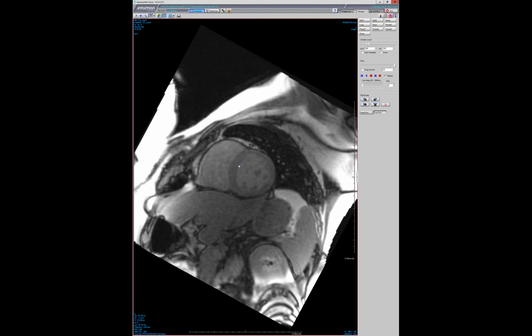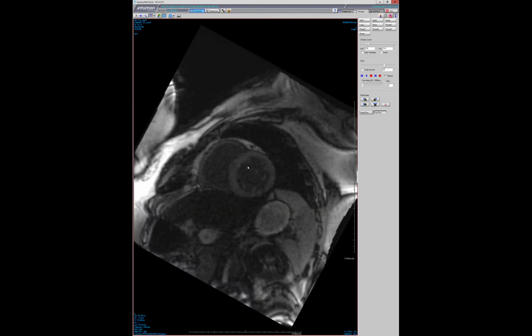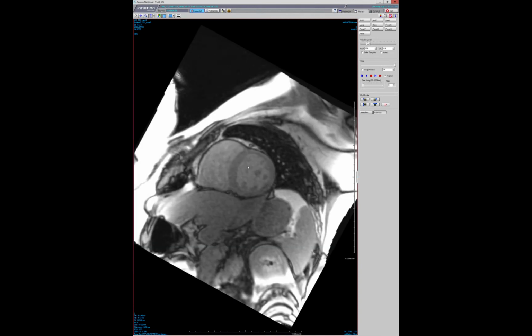So we know that this is a lysosomal storage issue, and they get fatty infiltration in the musculature. Because it deposits, they get the sphingolipids, I think. You guys know better than me, that can deposit. So here, even though the delayed enhancement looks completely normal, the tissue mapping helped suggest that there probably is some mild deposition in the myocardium, although it's not overt, and there's a little bit of hypertrophy which goes along with it.